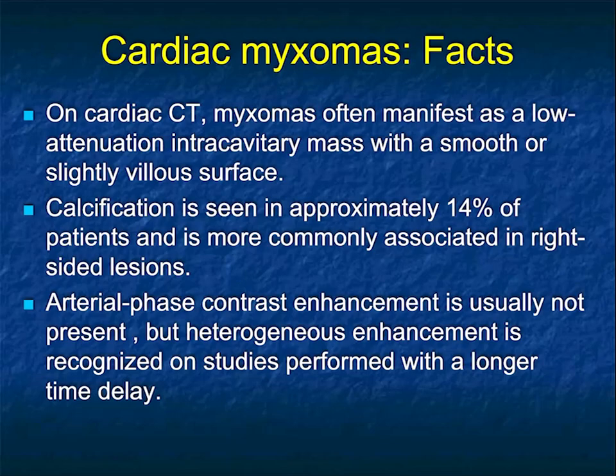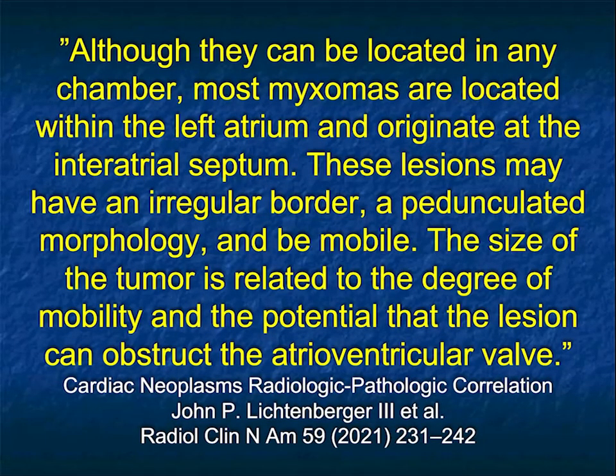Again, calcifications can occur, but in most series it's a small number, under 15%. And when they do calcify, it's more common in right-sided lesions. And arterial phase enhancement is typically not present. Occasionally you can see a little bit of enhancement on delayed phase imaging.